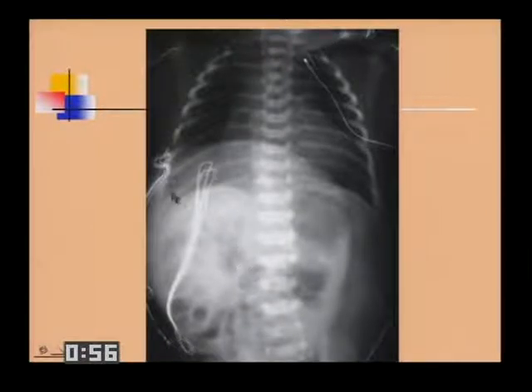You see this double density over the upper abdomen, and the diaphragms are pulled down. If a child has a giant omphalocele, the lungs and the thorax become hypoplastic. Now, if they try to repair it and they push this back in, the child will have respiratory distress as the diaphragms are driven up. And these lungs, at least for the first couple of years of life, as the child has very minor viral illnesses that other children will tolerate, this child may do very poorly with very, very minor illnesses. But the double density that we're seeing here is the omphalocele.